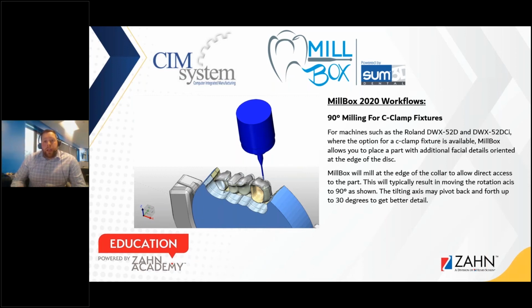And with this feature, we can not only come in at a 90-degree angle, we can actually rotate back and forth up to 30 degrees. So it allows us to get into those interproximal areas that we aren't normally able to get into if we just milled from the typical 5-axis or 3+2-axis milling process.